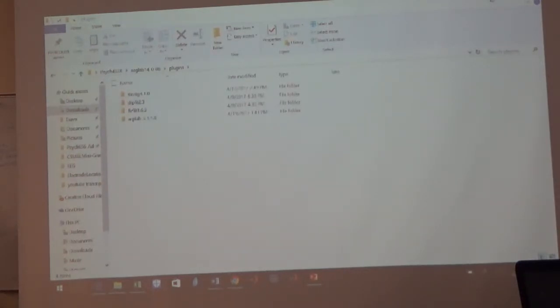Okay, so it sounds like most people are done. It should only take a minute to do. So when you're done, do what we already did. Load in the file, apply the channel locations. I'm just doing those two things for now, under script, right? Yes.